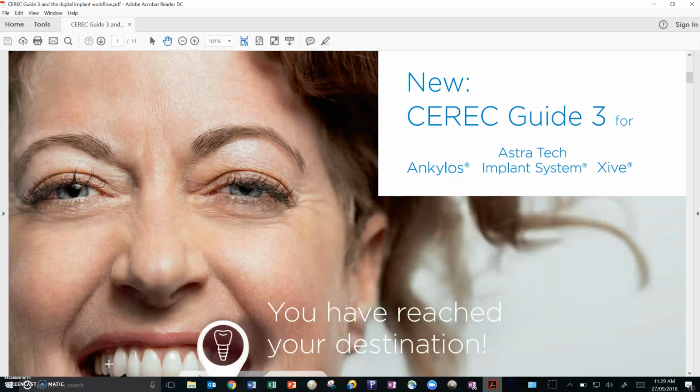Hi, this video talks about how we can look up the current Galileos Implant Database version on a computer, and if it's not the latest version, this video goes through how we can download the latest version.